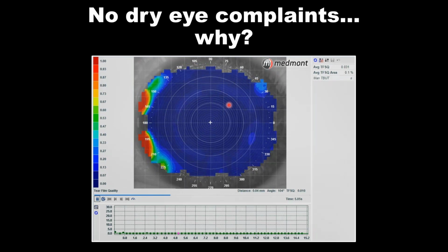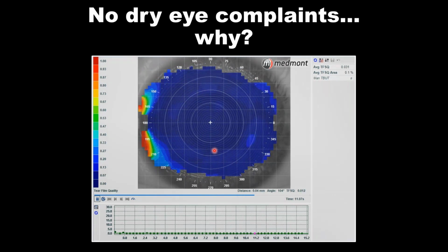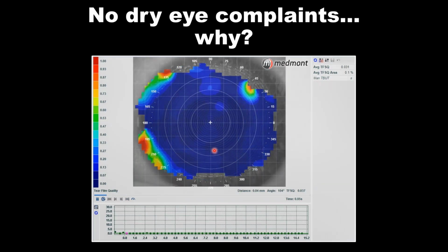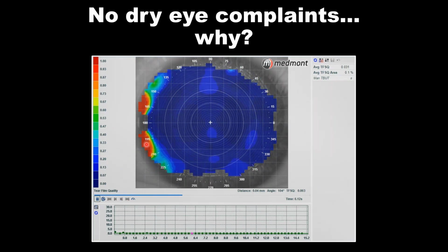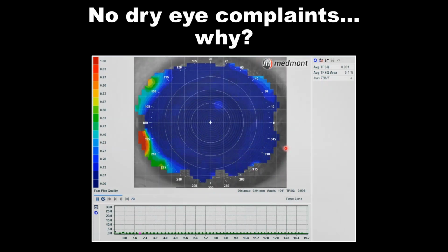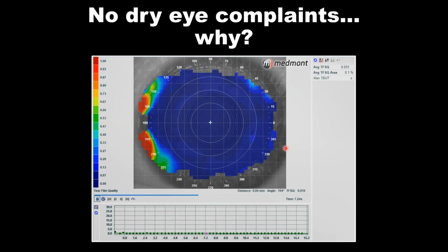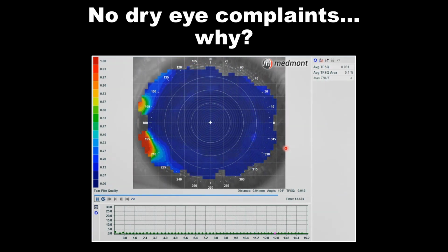The dark blue area is indicating to you from point to point on each one of those rings, the tear film really shows no elevation change. It's completely smooth from one point to the next. Where you see the red, that's where the points appear to have more elevation shift, and that's pretty normal for us to see that toward the peripheral cornea. But the reason this patient is doing so well is they have an awesome tear film. This patient has an ideal surface tear film quality, and that's most likely why soft lens wear is really a non-issue.